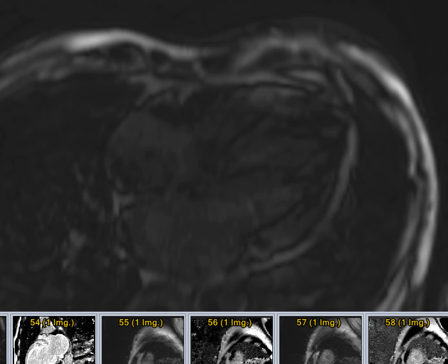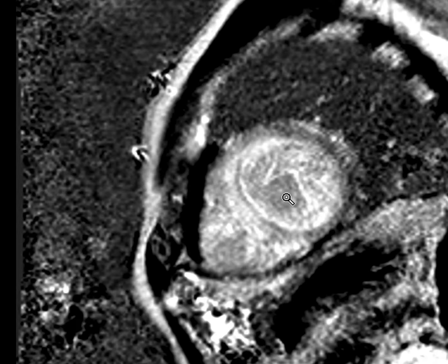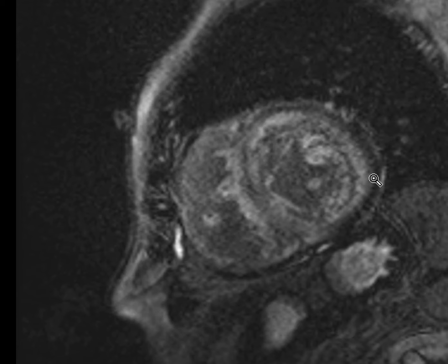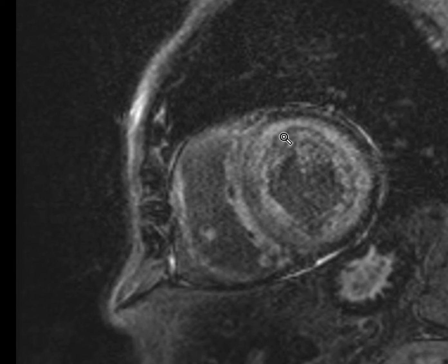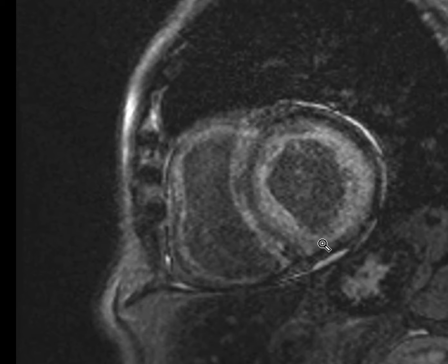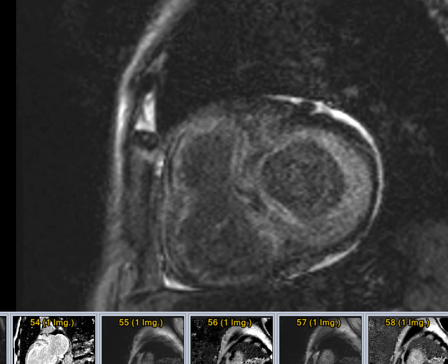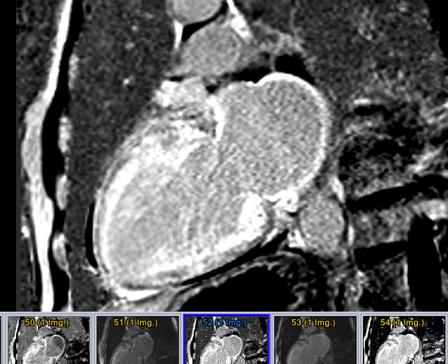If we move toward the late enhancement of the short axis, we would see a diffuse late enhancement in the whole myocardium. It's not territorial, but rather diffuse, involving all myocardial segments, mid-wall, or in some areas almost transmural. Diffuse again, late gadolinium enhancement.